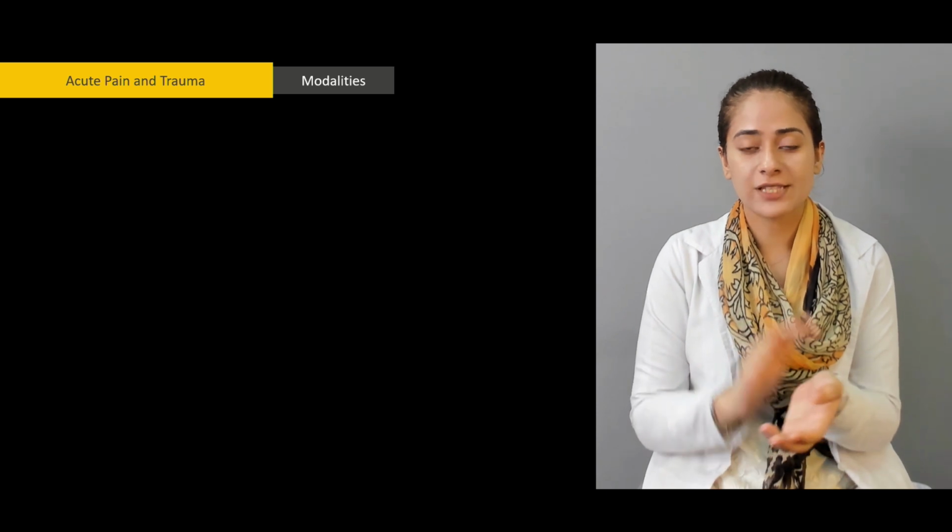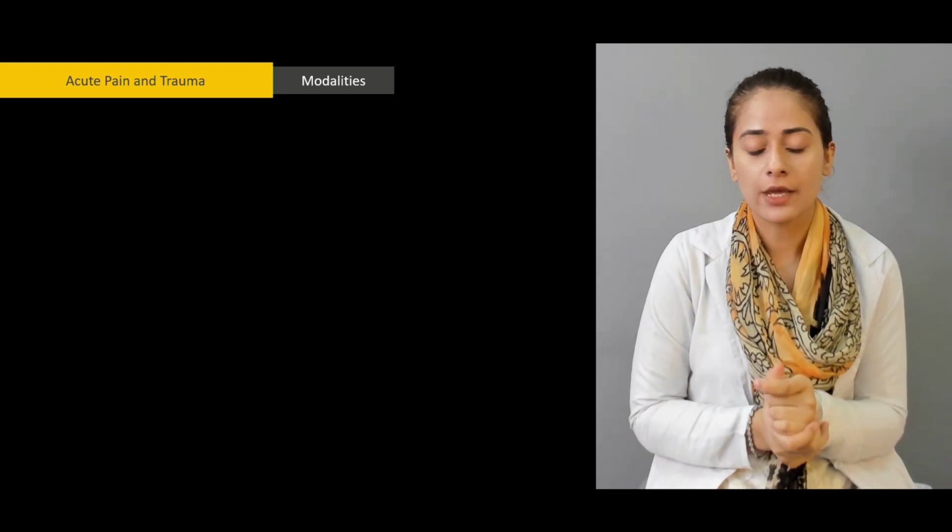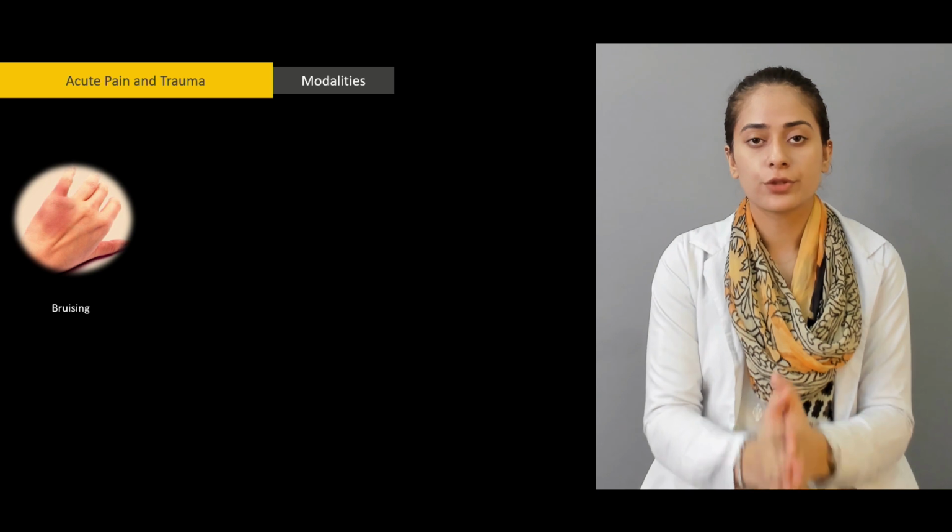In today's lecture, we're focusing on the wrist. The acute conditions for the wrist can occur if you fall on an outstretched hand, which can actually damage your elbow and your shoulder, but we're going to focus on the wrist. In the wrist, scaphoid fractures are very common when you fall on an outstretched hand. Other fractures are also common, but scaphoid fractures are very common. We're going to look at how they appear on radiographs as well. So let's start. First of all, we're going to see what the presentation of acute conditions is like.